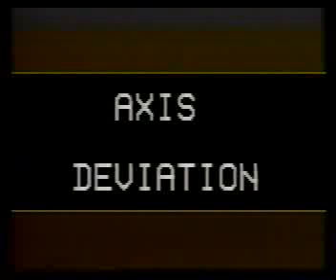This is another P mitrale, not notched but 3 small squares wide. In right atrial hypertrophy, the initial component is prominent. So the P wave is tall and peaked in lead 2, which is taller than 2.5 small squares. Since this is common with pulmonary hypertension, it is termed as P pulmonale.